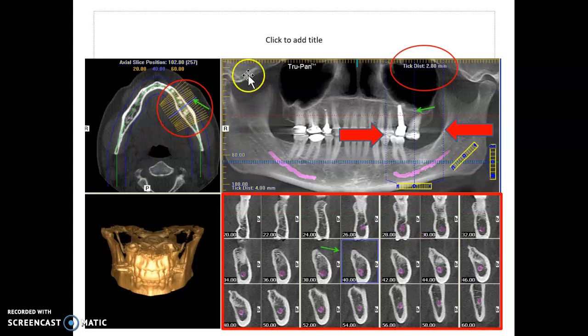Okay, so if this top corner is a horizontal slice, this bottom corner are vertical slices. So 26 through 30 is just making your way back through here. Number 40 is this blue line, that slice. The blue line is the blue square outlined. So when they made this image, they clicked on the number 40 image. That's why the blue line is right there and right there.